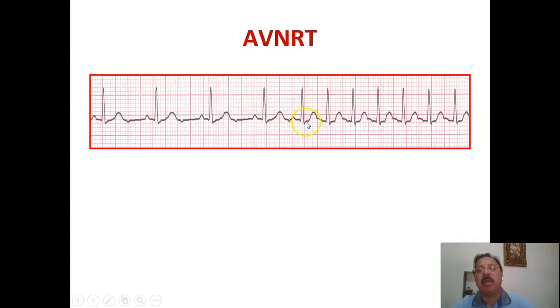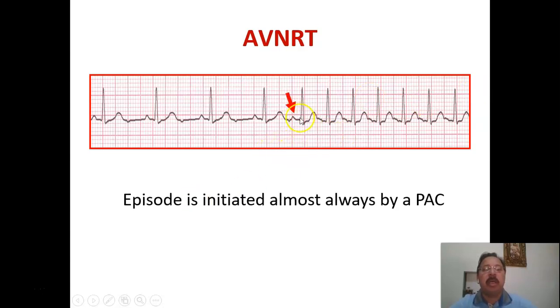from the sinus node and started producing its own arrhythmia, which is a narrow complex without P wave, and heart rate is almost 150, 160. So this is your SVT. So this is a paroxysmal SVT, the paroxysm of the normal complex followed by the ectopic beats and then the SVT. So this atrioventricular nodal reentrant tachycardia is almost always initiated by premature atrial complexes.